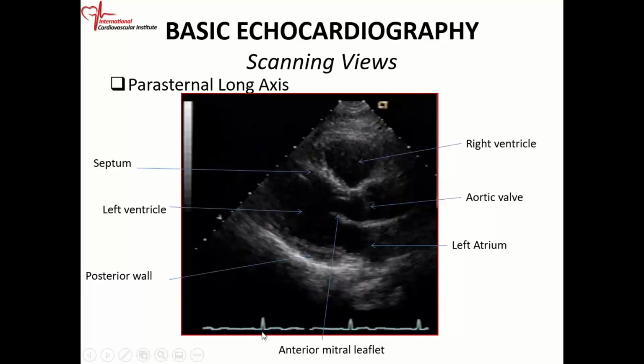Systole is from the onset of the QRS to the end of the T wave. So if you can scroll through this ECG, anything that comes between the onset of the QRS and the end of the T wave is a systolic phenomenon. Anything that comes from the end of the T wave to the QRS is a diastolic phenomenon.